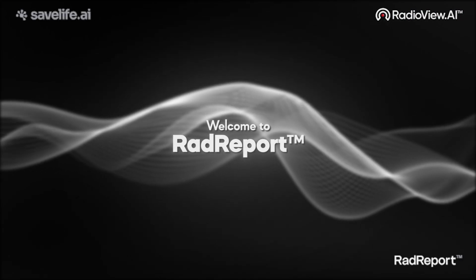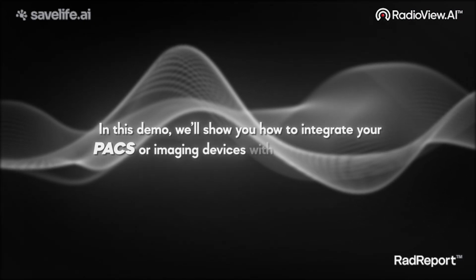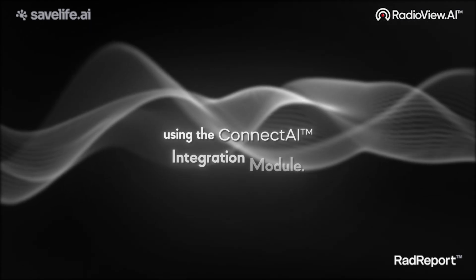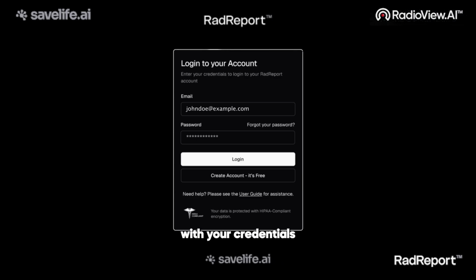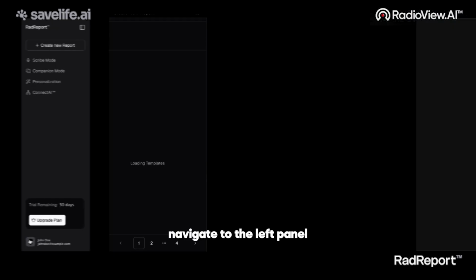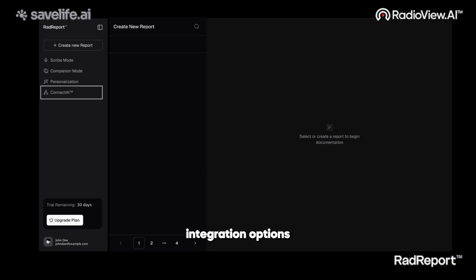Welcome to RadReport. In this demo, we'll show you how to integrate your PACS or imaging devices with RadReport using the ConnectAI integration module. Log in to RadReport with your credentials.